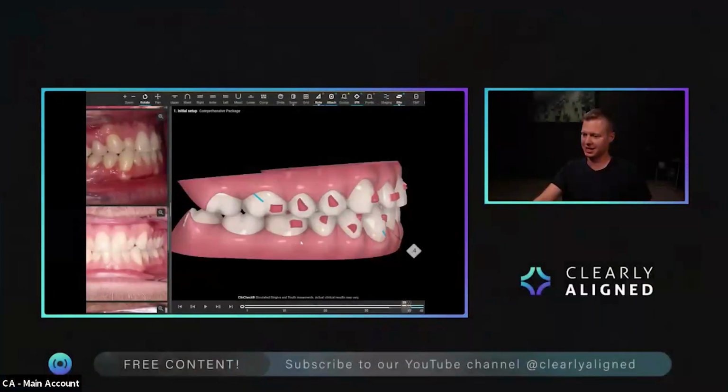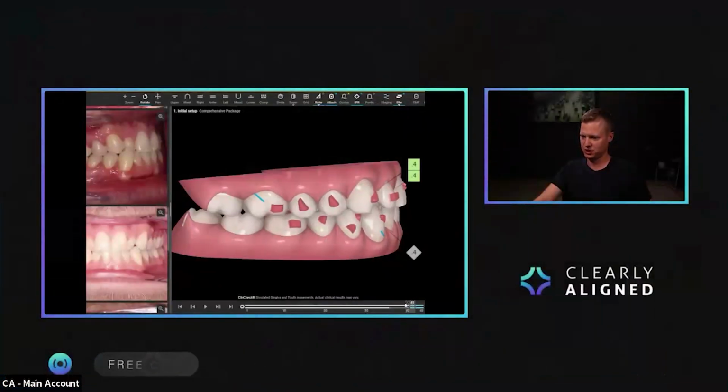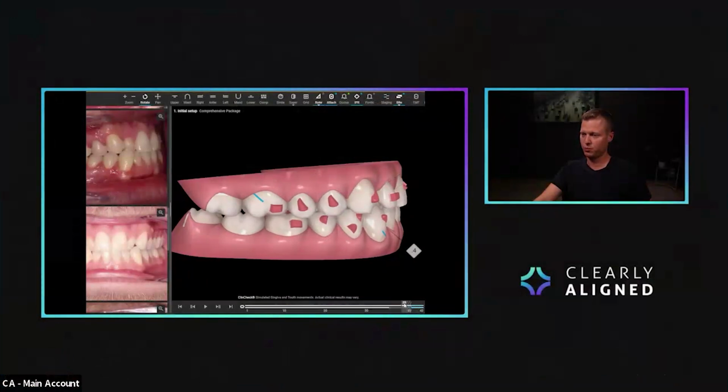In reality, the bite jump they're showing here is not realistic if we're using medium to light elastics. You're not going to cause TMD, but it will not actually happen as shown. This is, again, slightly a fantasy of what's being shown here. So the actual position will be the movements that happen before that jump occurs.